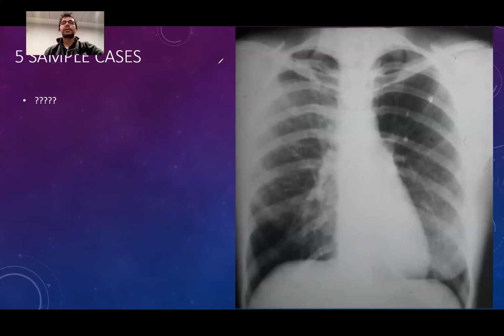Someone has mentioned mastectomy, which is very good. I'm seeing the breast here. This is actually the breast tissue. Here I don't see the breast, I don't see the breast lining. So this difference is coming from mastectomy. The patient is missing a breast here. But on the top side, our findings are just reversed. So there is some increased area of density on this side.